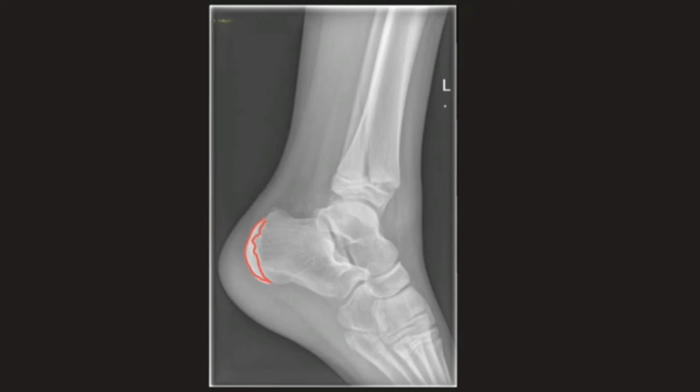When you look closely at the rest of the X-ray, we can see there is a fracture in the distal tibia, seen just here going through the metaphysis and then actually going through the growth plate. So this is in keeping with a Salter-Harris type 2 fracture, which we said before was the most common type of Salter-Harris fracture.